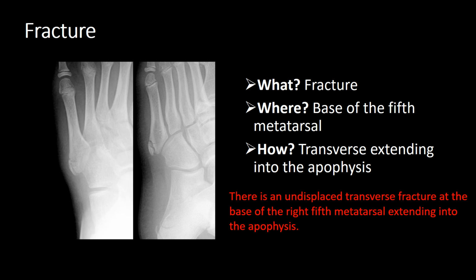So what is it? It's a fracture. Where? It's at the base of the fifth metatarsal. How? It's transverse, extending into the apophysis. Note, it doesn't actually communicate with the articular surface, so it's not an intra-articular fracture.